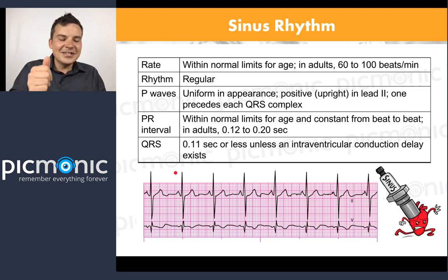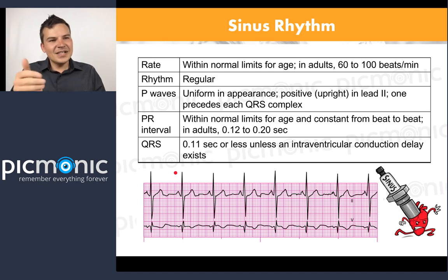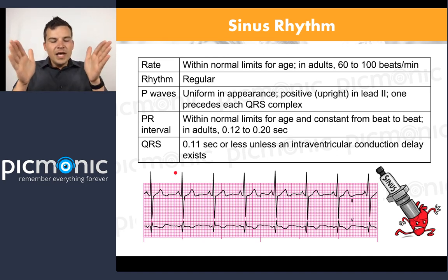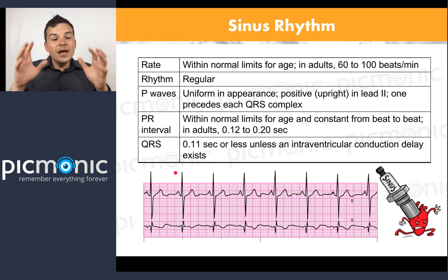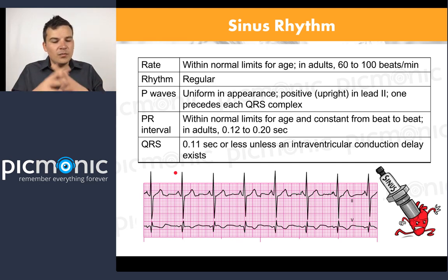So what you need to do is see if it's regular. Is it the same distance? What you're looking for is whether one's scrunched together or one's farther apart. That would be maybe not irregular, and we're going to talk about that.